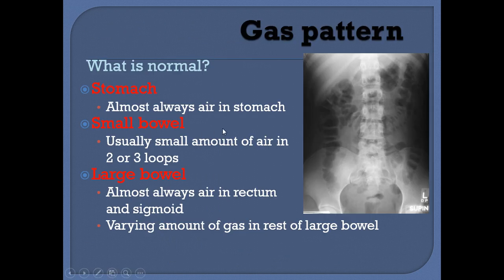What is normal? Stomach gas almost always occurs in the left upper quadrant until and unless there is some situs inversus.